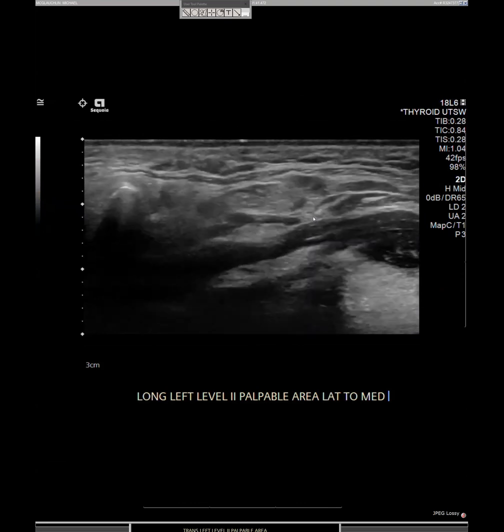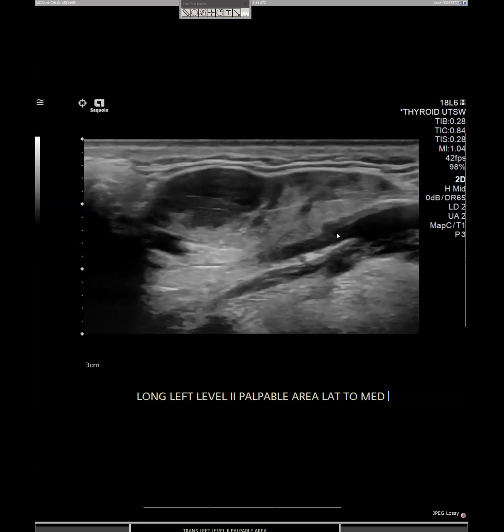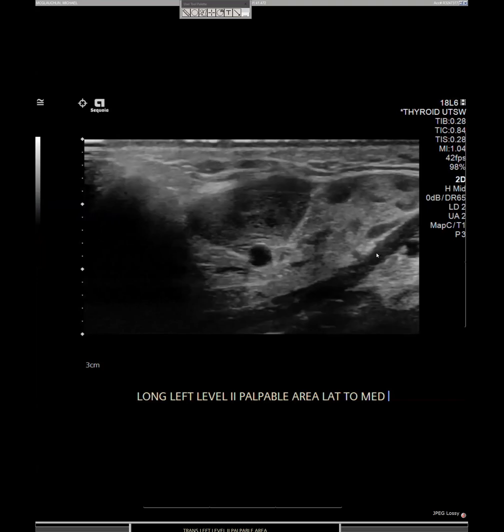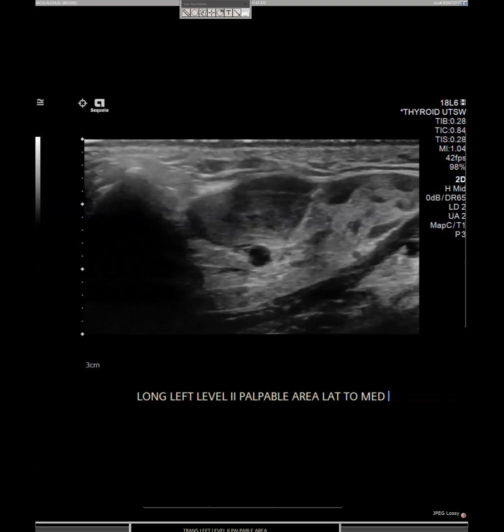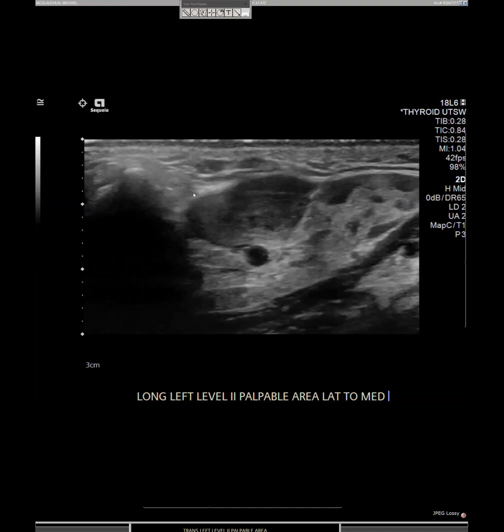Tarun is asking if there's a history of HIV. Yes, there is. Actually, was newly diagnosed 3 weeks ago. Epithelial cysts. Yes, lymphoepithelial cysts, usually seen in the parotid glands, but in this case seen in the submandibular gland. Classic with that history. And then, anyone guess what this was when we biopsied it?